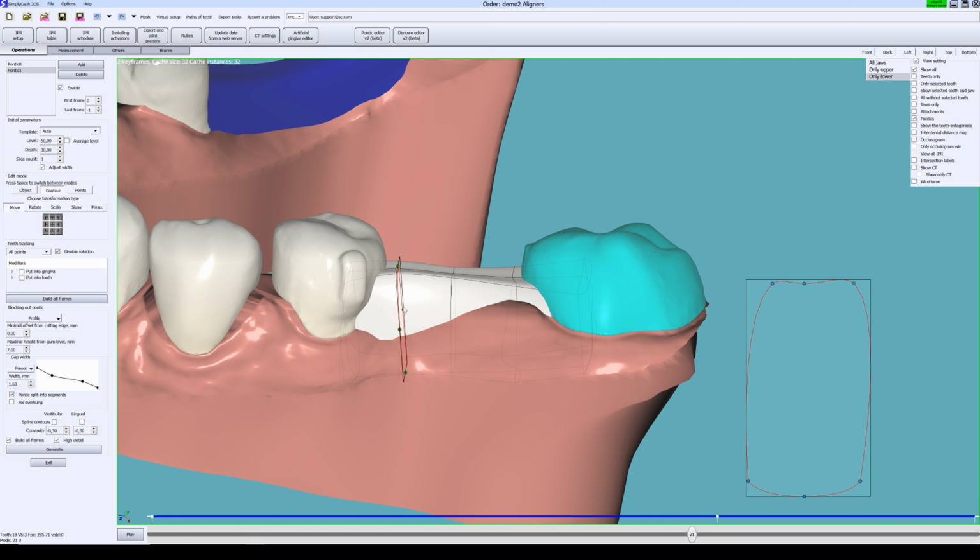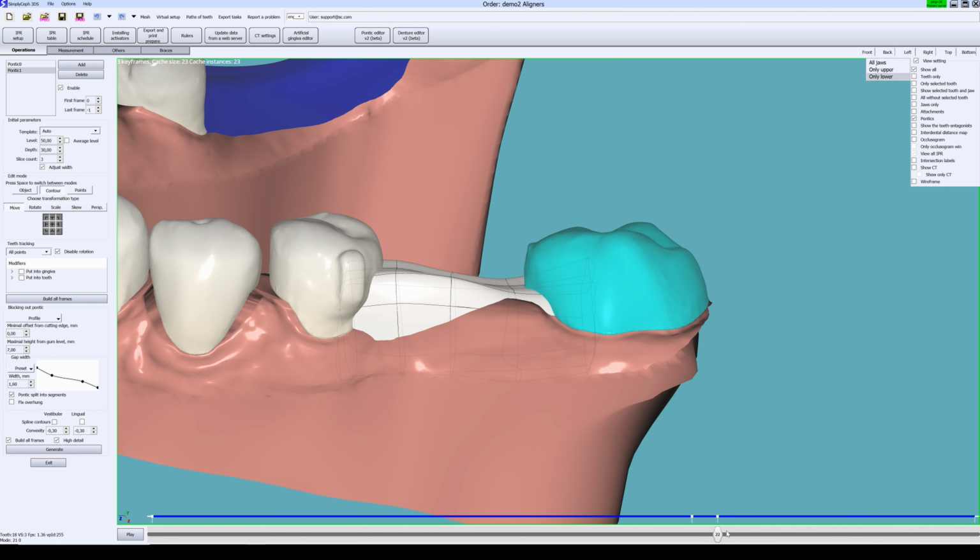Now I create a special modification for step 21 and use the tool move for editing mode contour. I play this moment to watch what I made. We see here two keyframes for steps 21 and 22. For each one a special pontic modification was made.